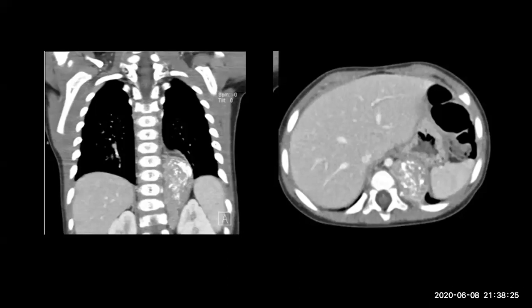Okay. This is CT. These are selected images of the CT scan at the level of the lower chest and upper abdomen. Okay, this is L1. Showing... Doctor, would you like to speak? Go ahead.